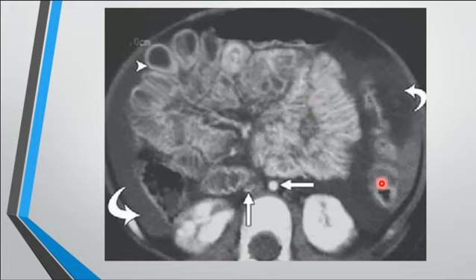Contusion. Also the right kidney seems to be shattered. The right kidney is shattered. Exactly, lacerated, with free fluid as well. There's fluid. The bowel wall is enhancing. And what else? What's this arrow? Why is it pointing here? The aorta. What's wrong with the aorta? Small caliber aorta. And the IVC is also collapsed.